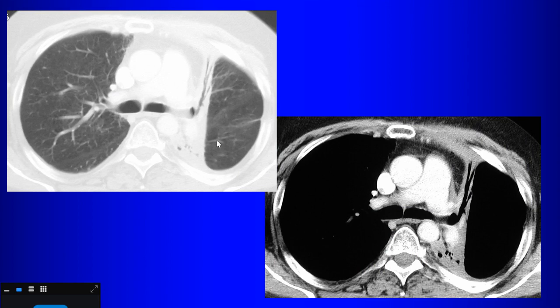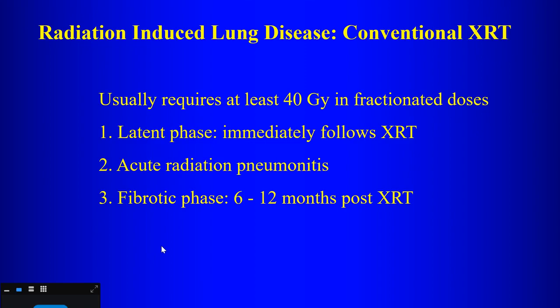The classic appearance of post-radiation therapy, that sharp demarcation. This is the scarred lung in here, traction bronchiectasis, not respecting anatomic boundaries, that very sharp demarcation between involved and uninvolved lung. And there's the fibrosis, loss of volume on that side from post-radiation therapy scarring.